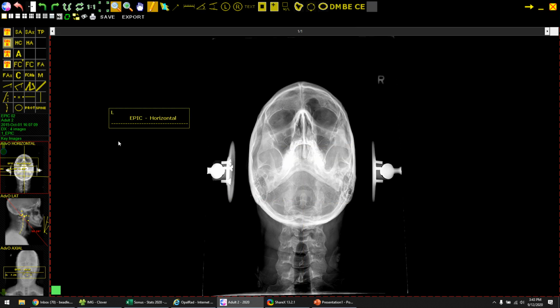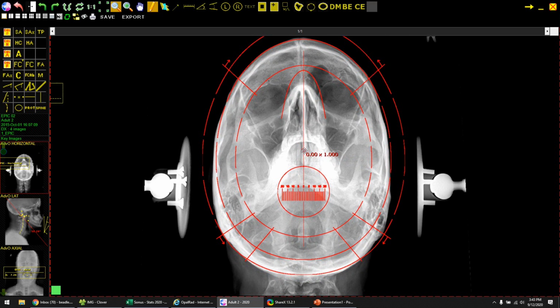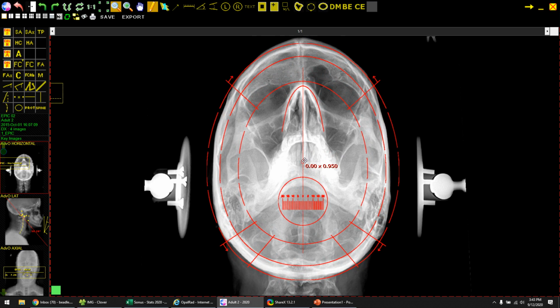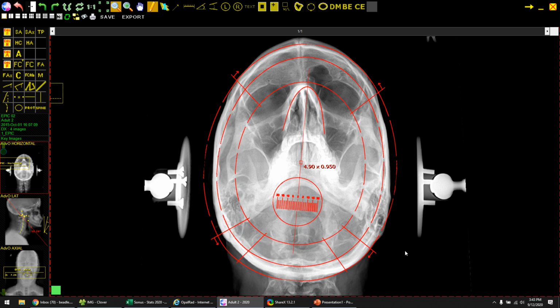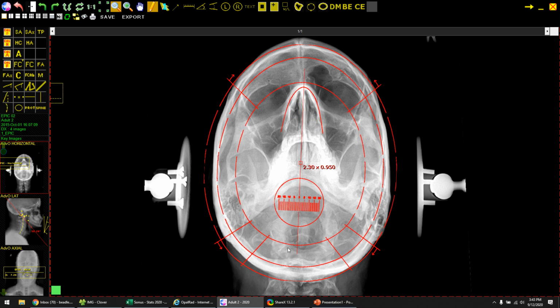So we first put down this little calculations box. The next one is for the horizontal cranium line. It's a template that will show where the symmetry of the skull is, trying to find out where the weight-bearing portion of the skull is. So I can go ahead and just show you real quick how we're looking at that. I look at the top 2 points up here first. Once those are in place, then we look at these points down here to make sure that it's actually rotated correctly. So obviously if it was rotated like this, I'd still be okay on top, but horrible on the bottom because here it's touching the skull, but over here it's not touching at all. So you want it to be symmetrical all the way around the skull.